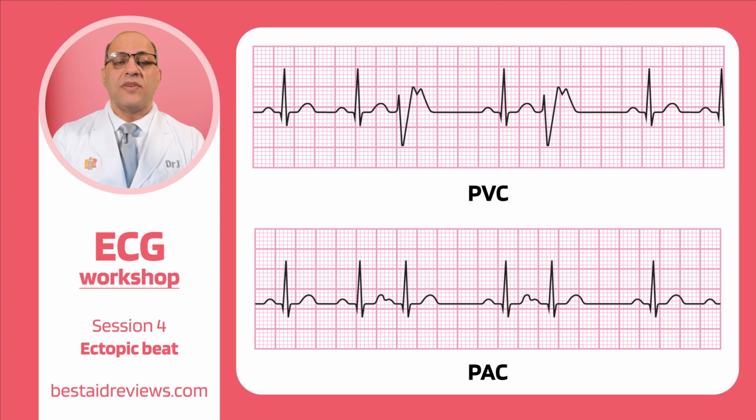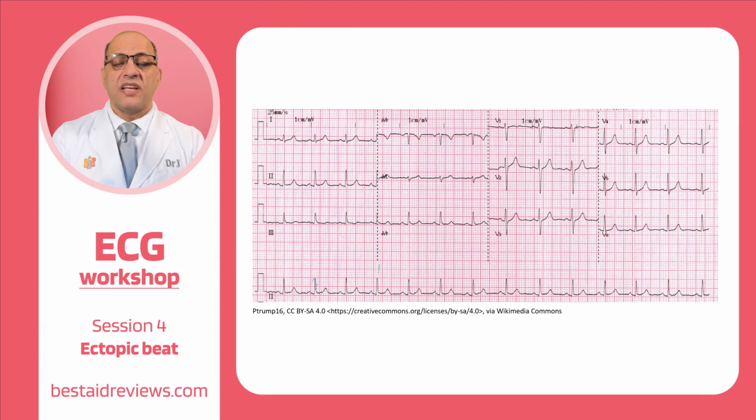We said if you have a 12 lead EKG, then at the end you have throughout the whole EKG lead 2 that shows for, let's say, 10 seconds or 15 seconds. You can see the activity of the heart in lead 2.